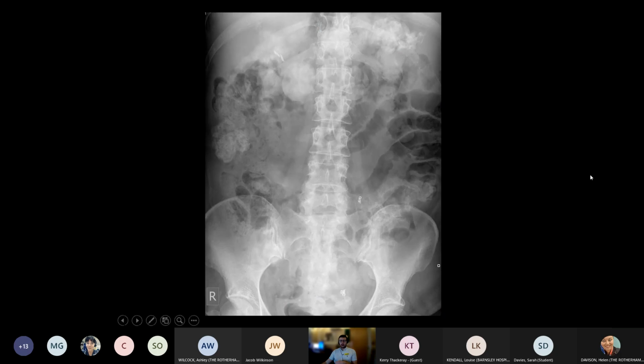We see here these multiple, I'll call them distended rather than dilated, small bowel loops, but we've got more than 3. They're under 3.5 centimeters, but you shouldn't really see this many distended small bowel loops. And this is a section here of ileus where you've got some adjacent pathology somewhere, and this section of the small bowel has decided not to work properly. Hopefully there's still gas and fecal residue going down to the rectum, and hopefully this will resolve on its own within a day or so.